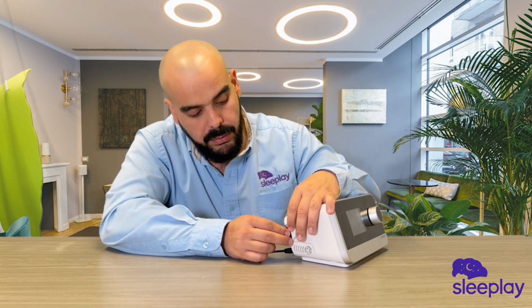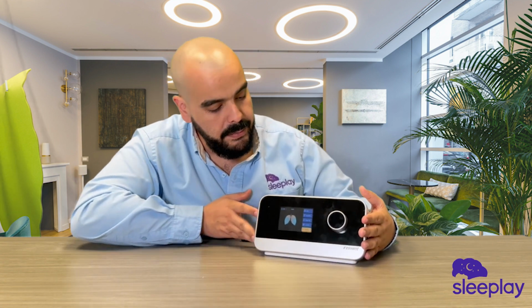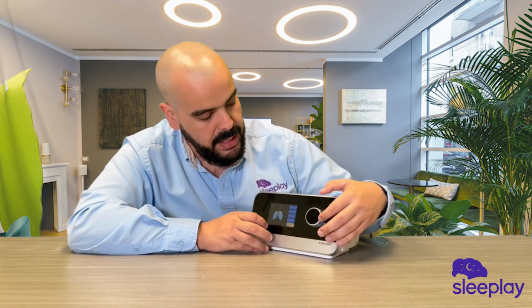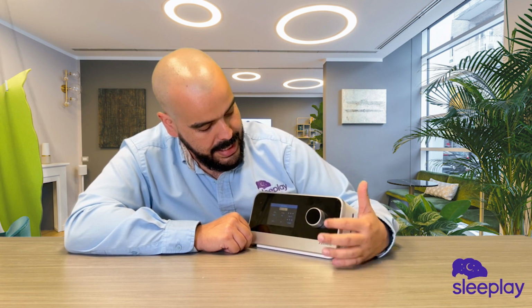And for those of you that want the quick and easy route to be able to monitor your sleep data, all you have to do is on the screen, scroll to where the info tab is, select the info tab, and right there it's going to give you your basic sleep data parameter.